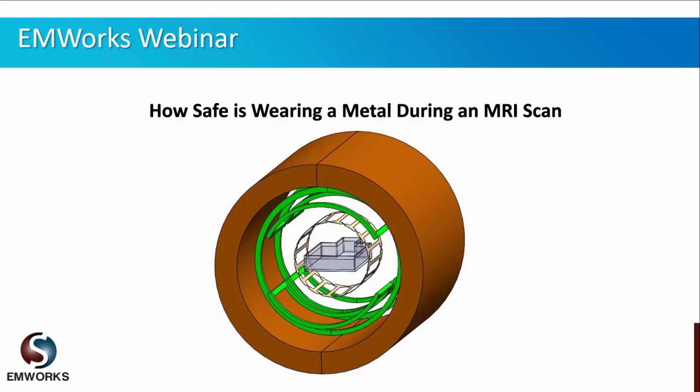In this webinar, we shall show you how to simulate an MRI using EMS and HFWorks and try to answer the question of how safe is wearing a metal during an MRI scan.